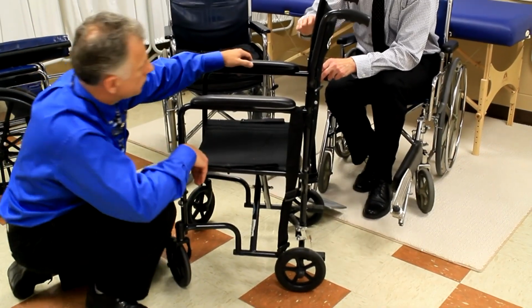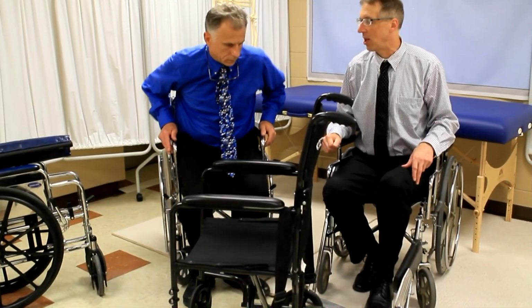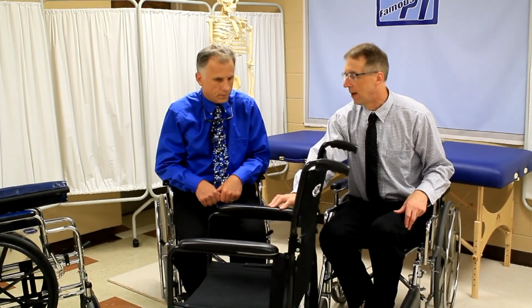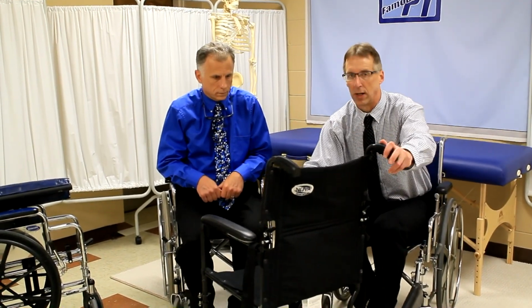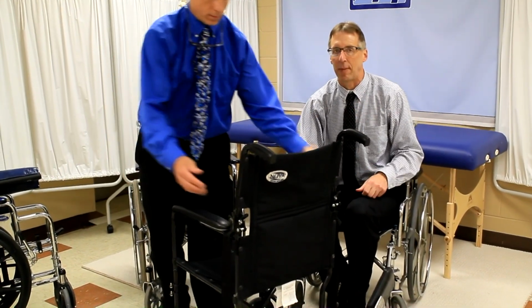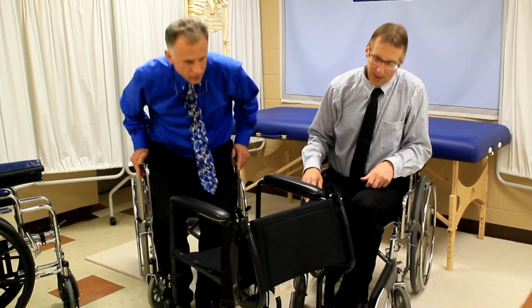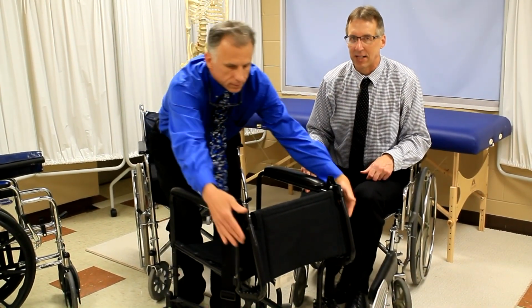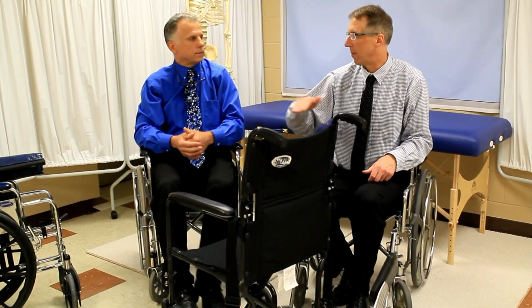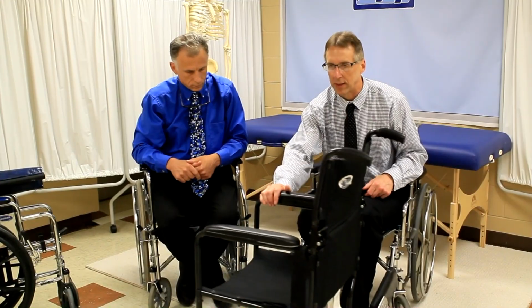The advantage to transport chairs is if you can't use your arms to propel the chair very well, and you're using your legs, the chair's a lot narrower. So within your house, you're gonna be able to get through doors and tight spots that you maybe normally can't. And believe me, there are always spots where you're gonna have trouble getting through, like between the toilet and the bathtub or something like that. So there is that advantage, it is one to consider.